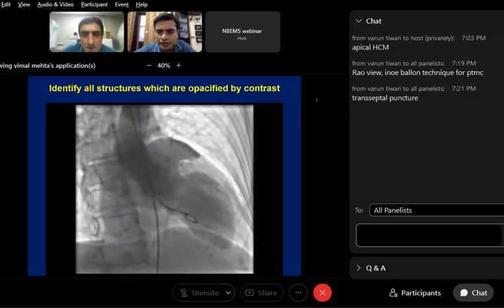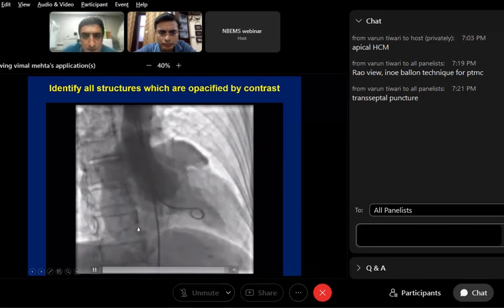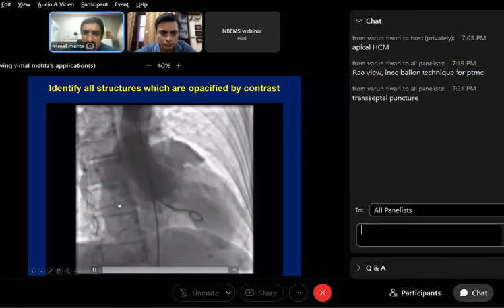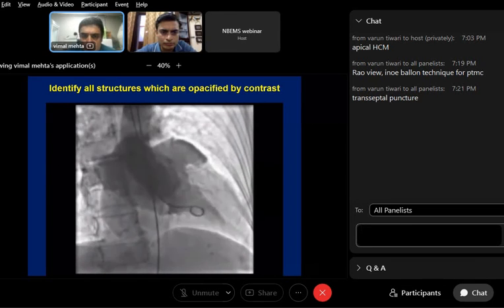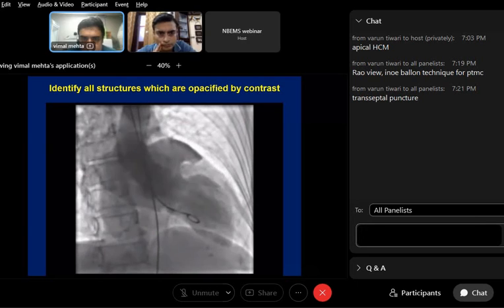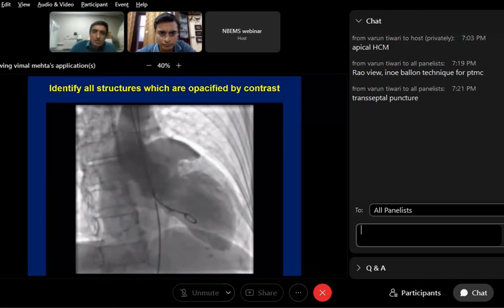Quickly. Beautiful angiogram. And pathology also. Everything is so beautifully seen. I mean, these days you will rarely see this kind of angiogram. People will not do it actually. Etiology I also want to know.